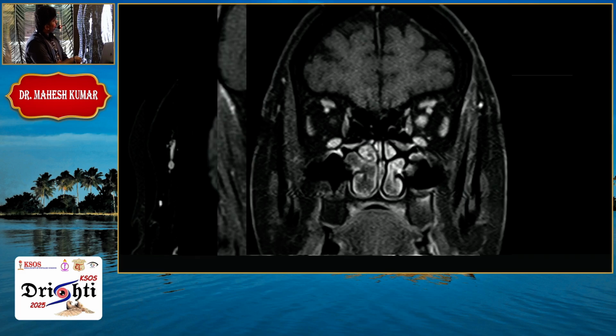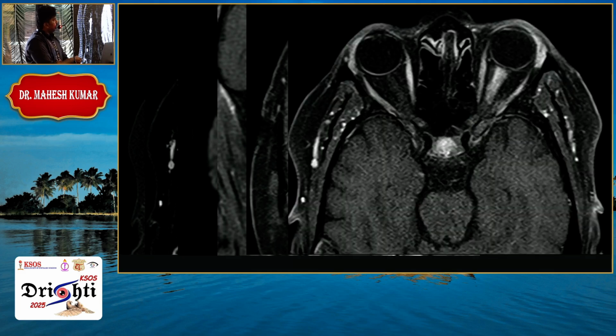And next we come to the post-contrast coronal images. You can see nicely symmetrical appearance of extraocular muscles on both sides, but in the center, the optic nerve is not enhancing on the right side. The optic nerve is enhancing on the left side here, and it is thickened. The same, you can see the loss of symmetry. Right side is normal, left side is abnormal. This is a case of left optic neuritis.